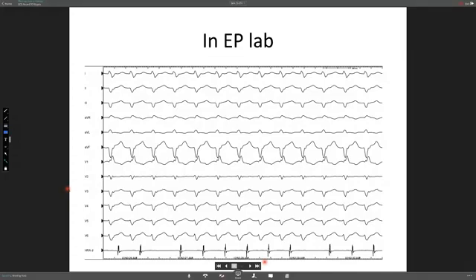I think here we have the advantage of the intracardiac recording, which I agree, Fathi. But when you see it in a resting ECG, sometimes it can be difficult. Sometimes it can be very easy, but here I agree. Especially in V1, you could see it really nicely there. So that's why I think a longer monitor helps.